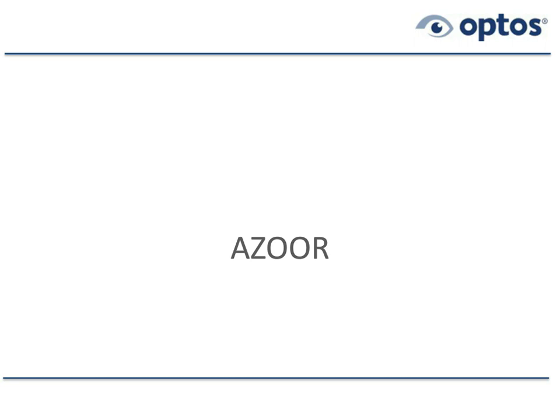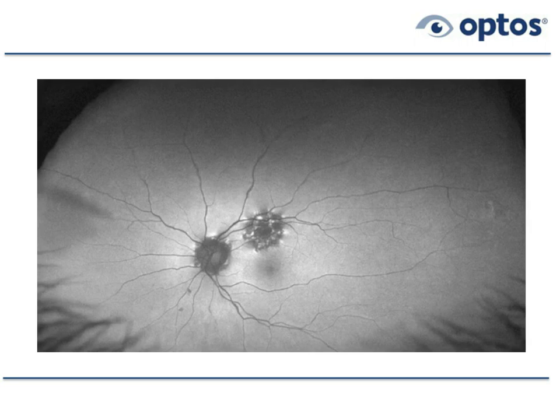This specific patient that we're going to see is about a 60-year-old female that I've been following for about 10 years, and she had AZOOR lesions, a large AZOOR lesion in her right eye. Then she came in, maybe 2 years ago, complaining about some photopsias and some blurred vision in her left eye. It still measured 20/20 minus or so. But as we can see here, there's a lesion which is above the fovea, and we don't have the color images here, we should, but it wasn't at all obvious on the color images.